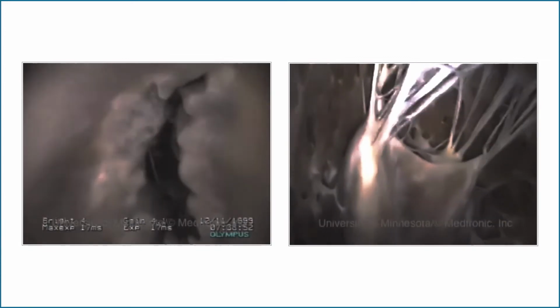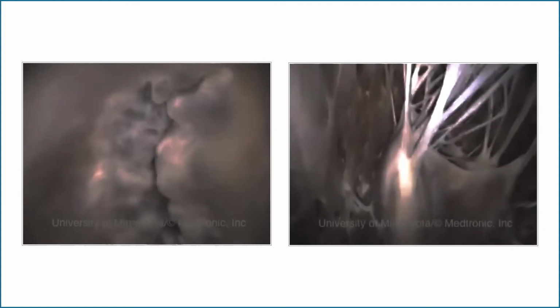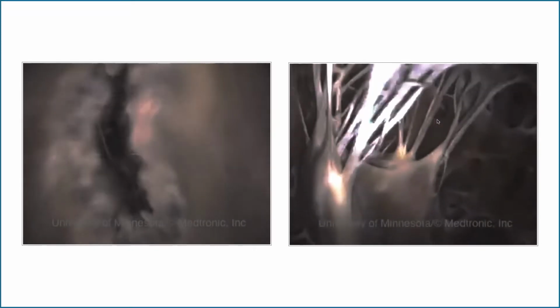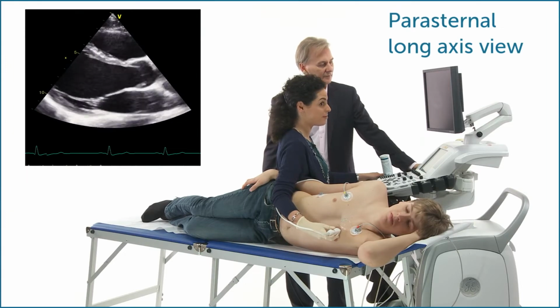You can appreciate how delicate these chordae are when you look at the mitral valve now from the ventricular side. Here, this is the papillary muscle, and right here you would see the chordal structures, which are relatively resistant, very strong, but still under certain conditions they can rupture, as you will see in a few examples that we're going to present to you during this lecture. But now our focus is on the mitral valve.